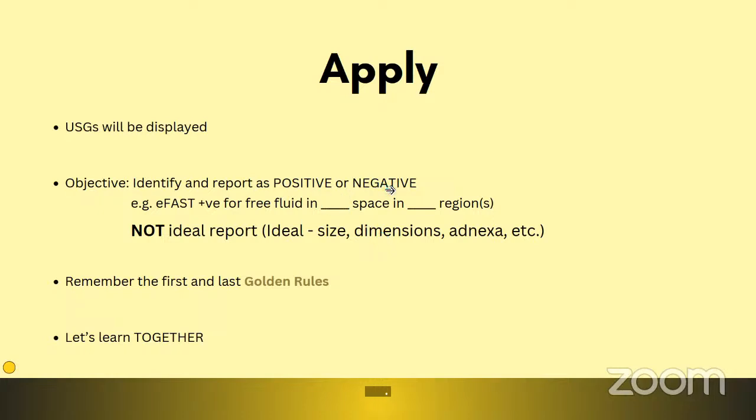eFAST should be done within minutes. It is so fast that people usually don't get to practice a lot in eFAST. The more patients you get, the more eFAST procedures you do, the more practice you get. So I felt there is little point in quizzing you. I kept a lot of images for you to learn all the special conditions and to diagnose. This is where we are getting the most interactive. So I want everyone to keep your chats open and help me with finding the images here.